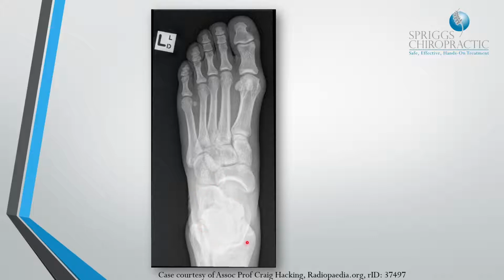If you get the exposure level right, you can see these areas of the tarsal bones. However, full body analysis of the calcaneus is not easily achieved with this, which is where the axial calcaneum view comes into its own as a really good way of evaluating that area of the calcaneus as a dorsiplantar projection.